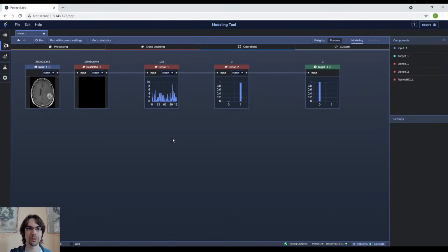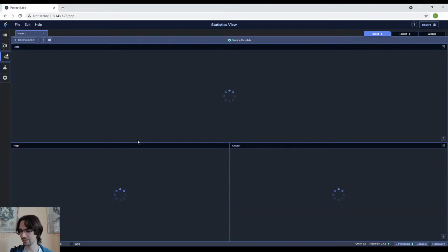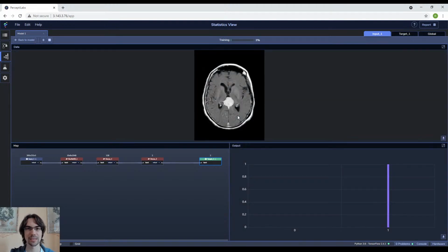That pre-processing option is going to be on by default and automatically rescale your data. You can of course turn it off, but that'll make sure that you don't need to worry about that any longer. So let's run this one. This one might take a little bit longer to start. But there we go.